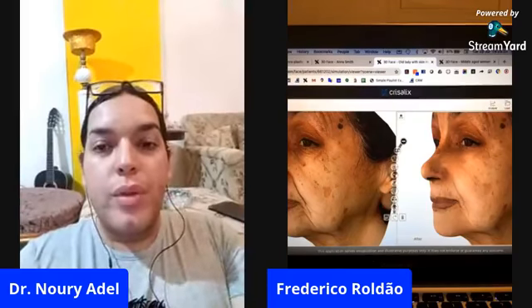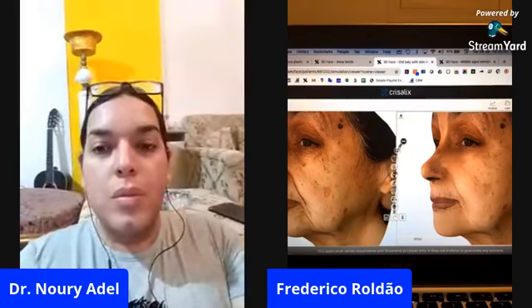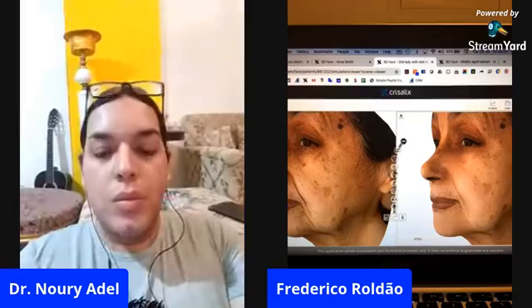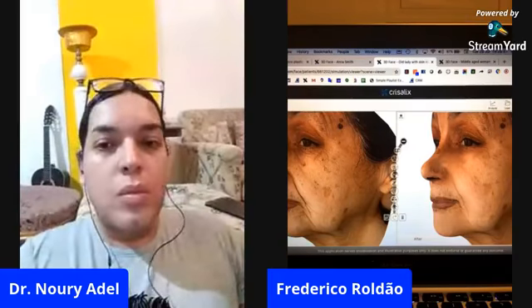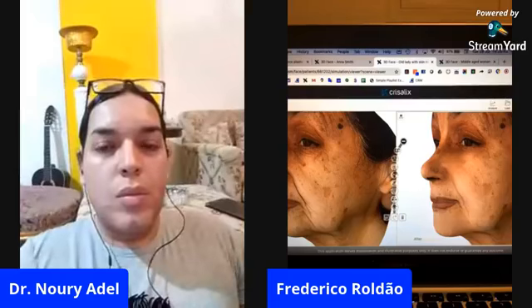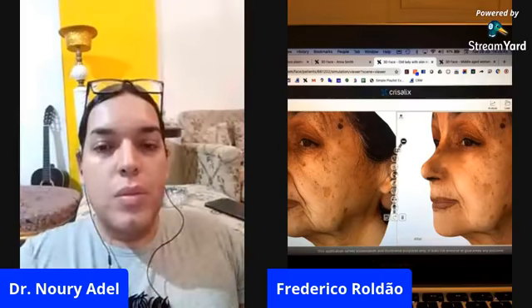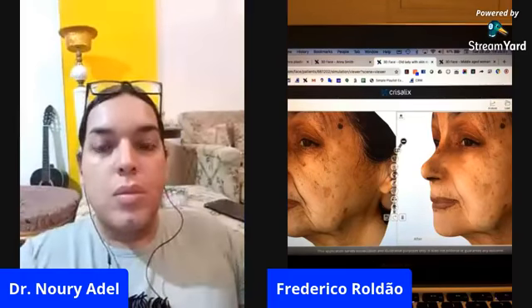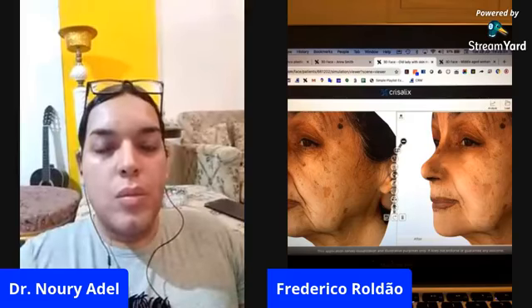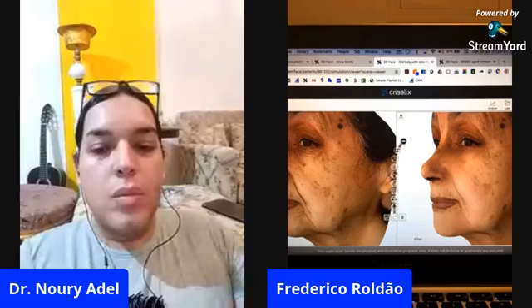And when I say the evolution between two treatments, you can see the evolution between 2, 3, 4, 5, 10, 100 treatments if you want, because you can collect all the images that you want. So you have your patient's history in one place, which is your Crisalix license. One big advantage of this is for those cases that your patient comes after a few weeks and says, "Oh, doctor, there is no difference."